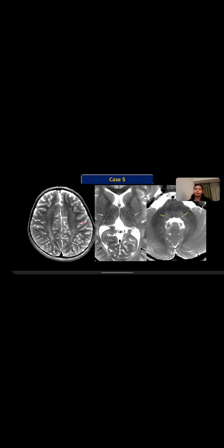We do not see diffuse hypomyelination, but we are seeing hypomyelination only in certain structures. So, there are white matter hyperintensities involving the pericentral white matter. There is hypomyelination involving the optic radiations, as well as the dorsal brainstem. So, what are your guesses about this? So what are these actually? This posterior limb of internal capsule, periatrial white matter, and posterior dorsal brainstem.